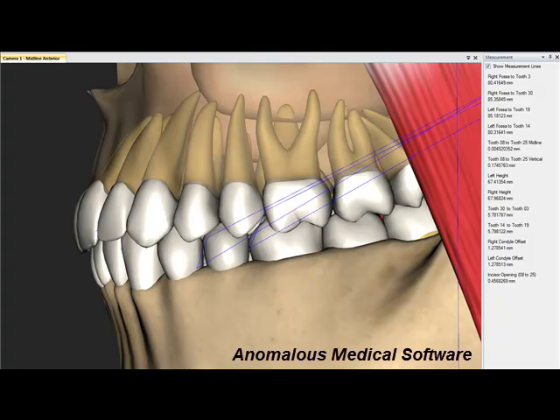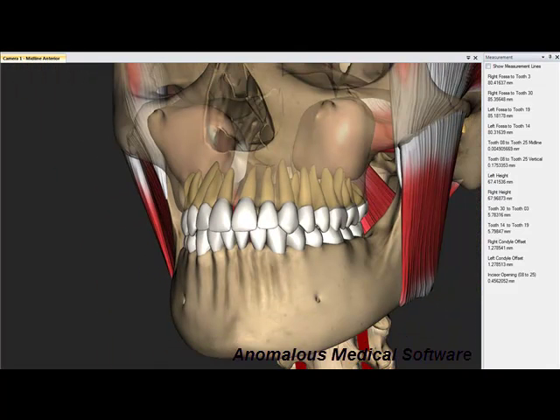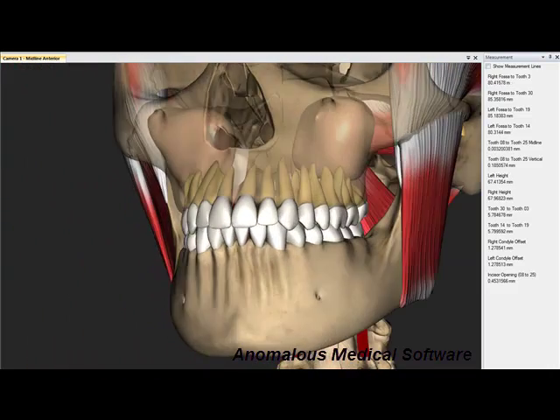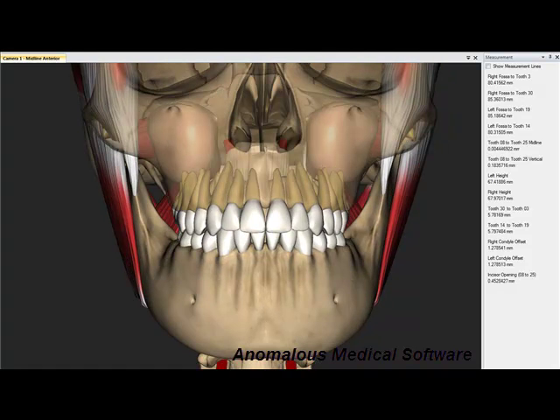So that relationship would also tend to change depending upon how much clenching a patient might do in the back end. So here we have carefully modeled subject software that shows that indeed there is a change in the occlusion with any kind of change at the level of the temporomandibular joint. This modeling software actually allows us in some of the areas to go out to 1/100 trillionth of a millimeter to measure the changes. Of course, these changes are actually much more gross than that, and you can see on the order of a half of a millimeter to several millimeters of changes in the system, again depending upon what happens at the level of the temporomandibular joint.